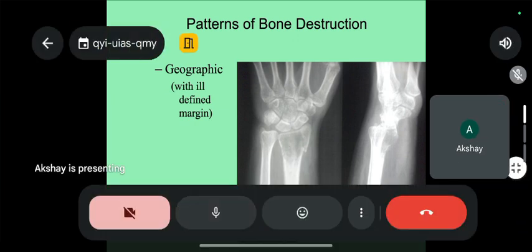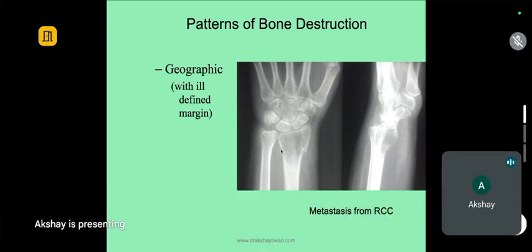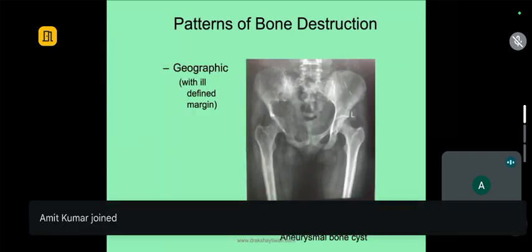There is a fracture in this also. So right now we will not decide benign or malignant based on just one lesion or one description. We know this is a geographic kind of destruction, but still we can see a fracture, we can see cortical expansion and destruction. So we know this is probably a malignant lesion. Right? So we'll put everything together, only then decide whether it's benign or malignant.